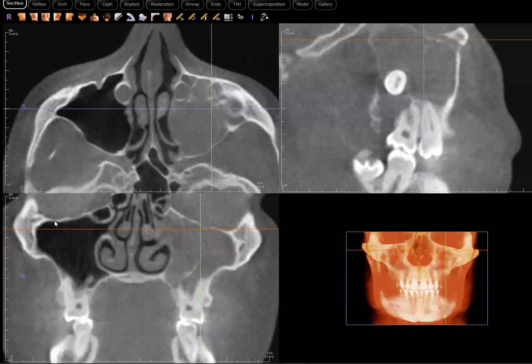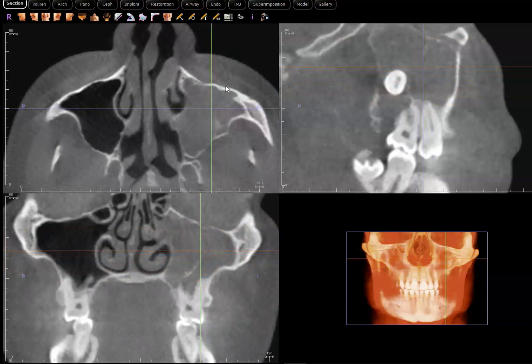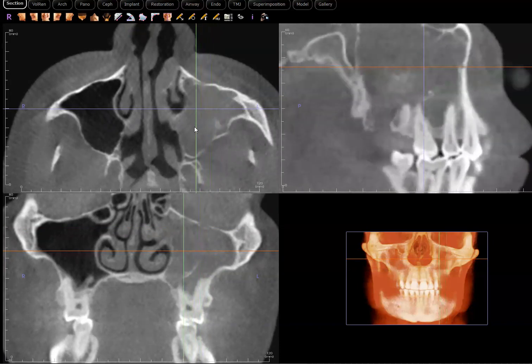Also, if you look at the roof of the maxillary sinus, or the floor of the orbit, they appear grossly symmetric bilaterally. Now we've had the chance to appreciate its behavior, at least on the walls. Let's see what else we can find.